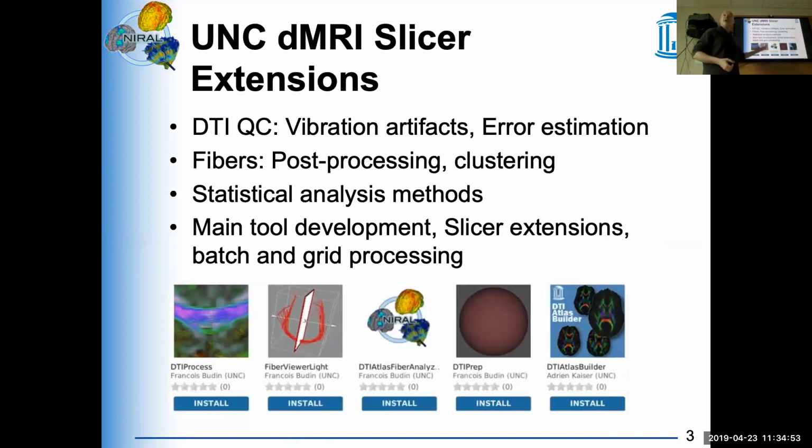So what we're doing now is we have our own Slicer version. It's called SlicerNeural. And that's still in development. Juan has been pushing that, and that's really great. So we have our Slicer version that comes with our extensions. You download our Slicer, it has all these extensions there that you need. And once in a while, we may update that. But we are not bound to the Slicer updates anymore.